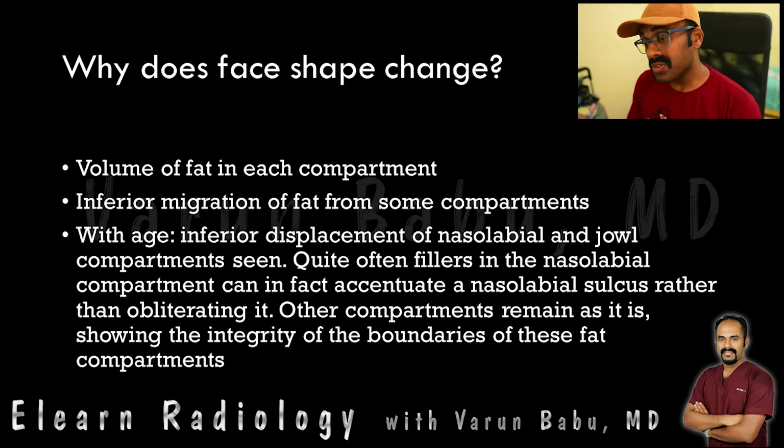So usually putting fillers in the nasolabial compartment and the jowl compartment can in fact accentuate a nasolabial sulcus rather than obliterate it. The other compartments usually remain as they are, preserving the integrity of the boundaries of these fat compartments.